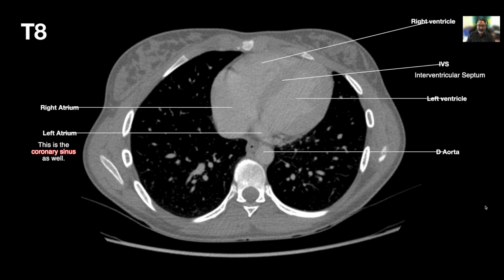What's that little hole? Is this an extra thing? We didn't do it, but the azygos. No, the azygos is right here. A structure that would have air in it at this point.